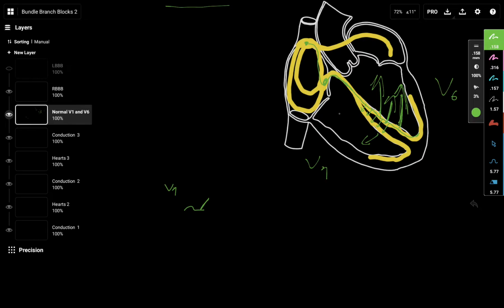That's why, despite both ventricles in a normal situation depolarizing at the same time, I will pick up the depolarization of the left ventricle, which is currently traveling away from lead V1, yes, towards V6. So what's going to happen here? After this slight positive deflection, it's going to be a big negative deflection this way.